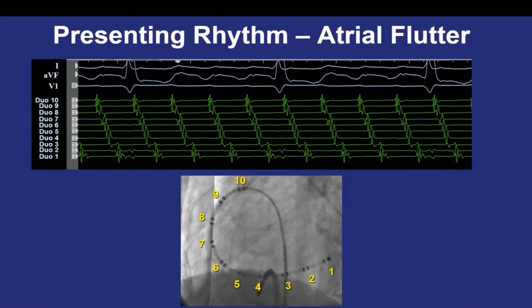Because the activation started from up, down. But clockwise is also up, down. But it is on the other side. Because it is away from the normal direction of flow of the electrical impulse, that's why it's negative.